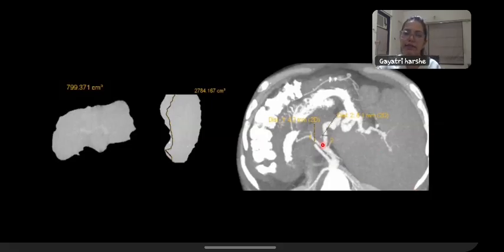So as well as there are few other things, where the hepatic artery diameter and the splenic artery diameter, the difference and the dilatation of the splenic artery. In this particular case, there were a few aneurysms in the splenic artery.